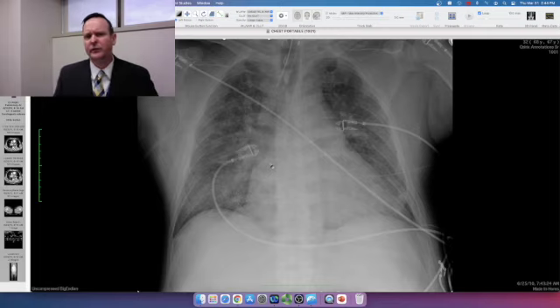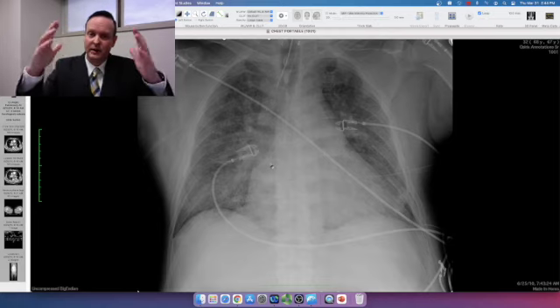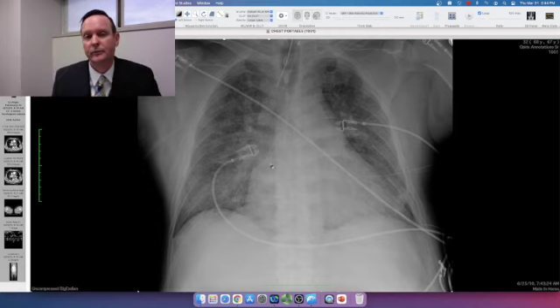There are 5 things that I look for in pulmonary edema, particularly cardiogenic pulmonary edema. That's going to be cardiomegaly, vascular redistribution, where the pulmonary vessels are overcoming gravity and distending in the superior lung, consolidation, either parahilar or bibasilar, interstitial thickening, and pleural effusions.